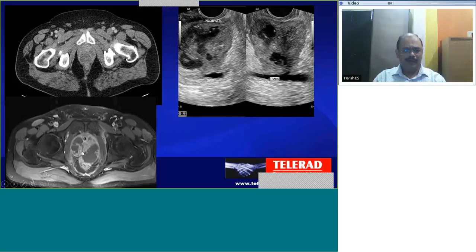Similarly, on the ultrasound, post-contrast MRI demonstrates a diffusely enlarged gland with a large abscess, multiple abscesses with one of the abscesses extending posteriorly into the periprostatic soft tissues. The ultrasound can also detect the presence of abscesses in case of prostatitis.